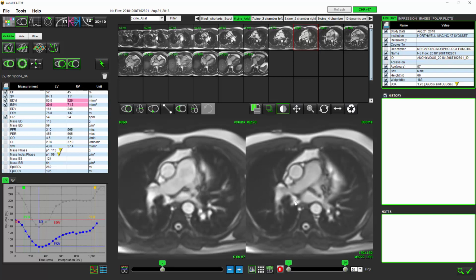artery in all of your patients. I recommend measuring each at least twice to assess the reproducibility of the measurement. It's quick and easy to do, and it can help steer you to the right diagnosis.